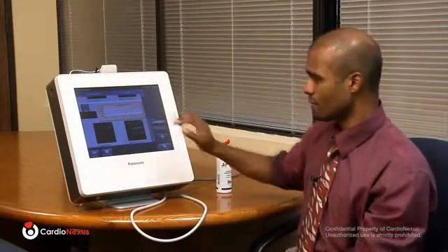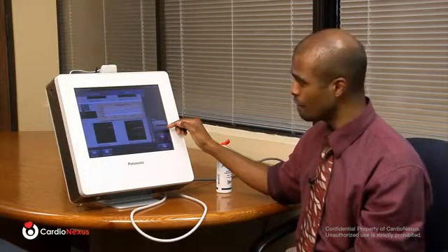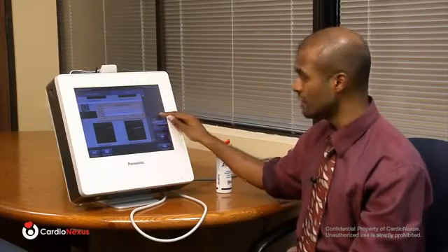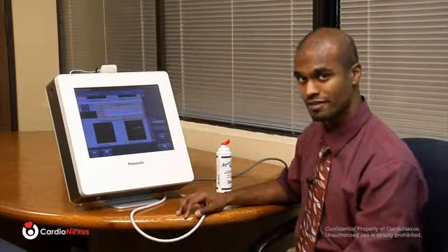So all of this can be printed either to a USB printer, which would be attached and simply chosen from the drop-down menu here for printer, or if the patient has their own USB memory drive, or if you have an external hard drive that you'd like to save it on, you can print right to PDF on any external memory here. Once you've gotten to this point of the exam, you've completed one CardioHealth test.